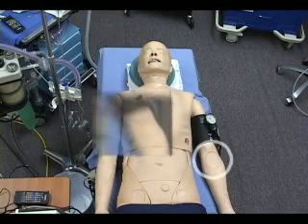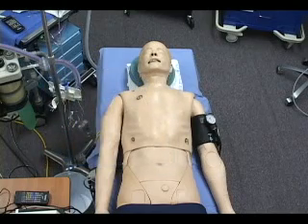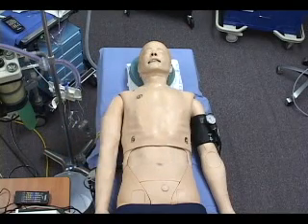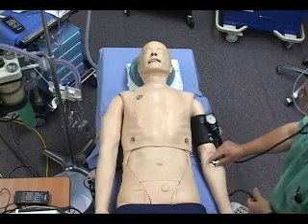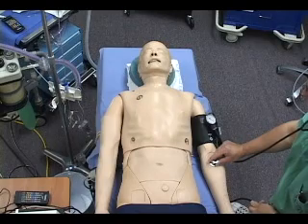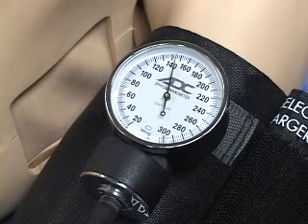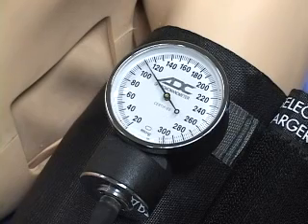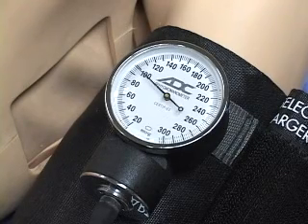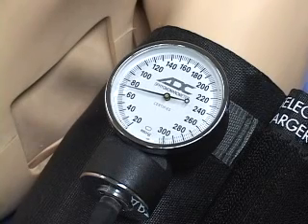Underneath the circular area in the left antecubital fossa is a loudspeaker that provides Korotkoff sounds. Although it is a common mistake, pulses cannot be palpated here. Instead, place the stethoscope firmly here and proceed to measure a manual blood pressure as you normally would. Although you won't see needle oscillations, you'll be able to hear the Korotkoff sounds as you slowly lower the cuff pressure. The beat-to-beat sounds will first be heard at the systolic blood pressure and will persist as cuff pressure decreases. The diastolic pressure is signaled by the loss of the auscultated sounds.